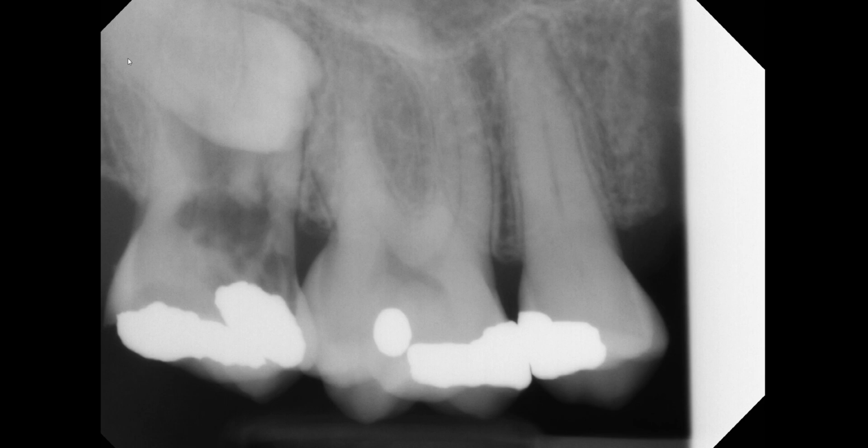If you decided not to remove this, and let's just say that the ridge healed perfectly, ideally, but then what is our restorative option? We won't be able to place a dental implant. That's another thing that we have to consider because of the crown and the position of the third molar. So yes, there are a lot of things that we have to consider other than simply recognizing what this is.